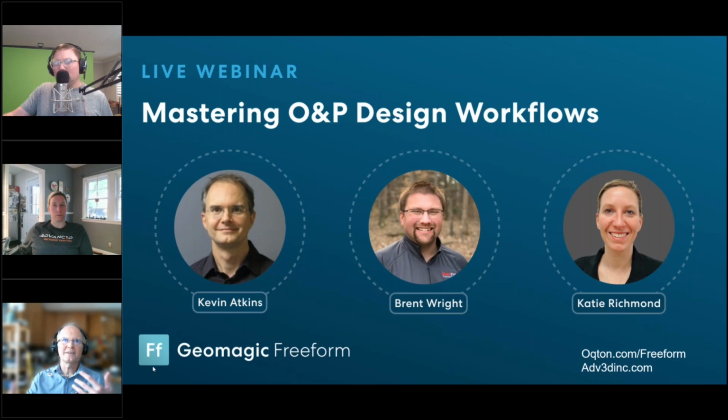It's various things. Each different way has, like Brent was saying, you're getting into the weeds of one thing works well in one place and not the other. But 9 times out of 10, you can just use some of the major commands and just get it all done. Always different ways to do lots of different things.